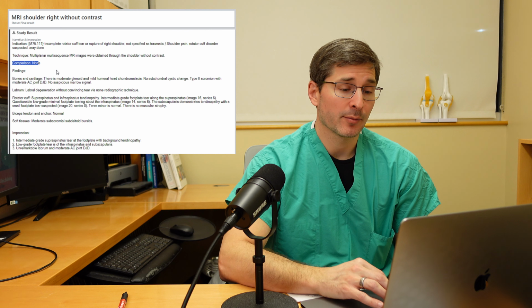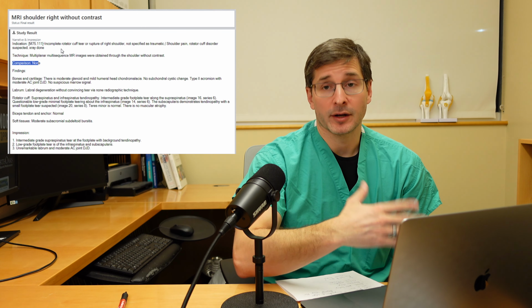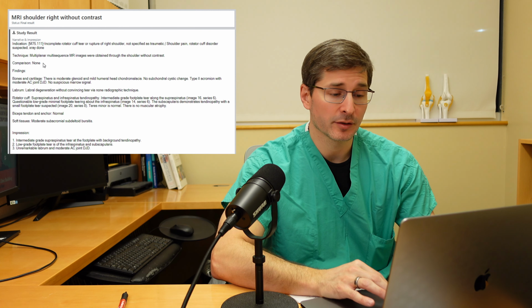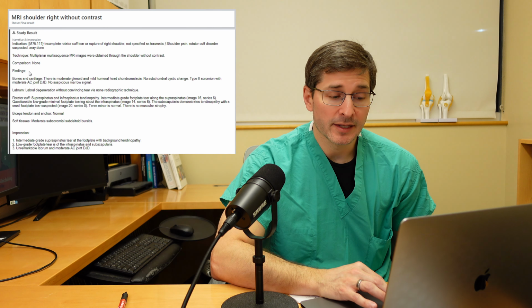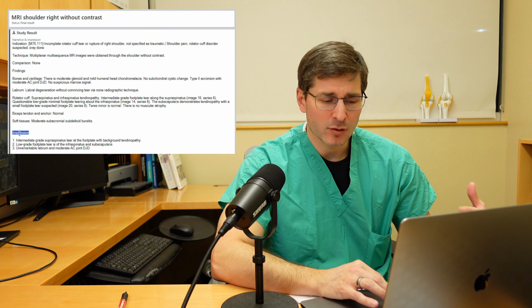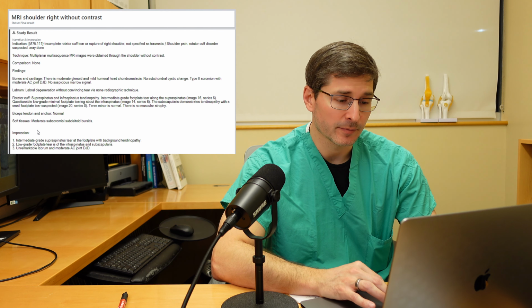Say if this patient had an MRI done a year ago, the radiologist can actually compare that. So in this particular patient, there was no comparison. And then they get into the details of the report under findings, and then further down you'll see a summary called the impression.